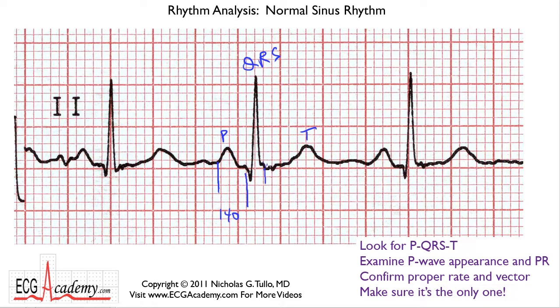But you see this little jiggle here? Is that part of the QRS or isn't it? Well, here's where you need to look at the trees, the individual trees, because if you look at this QRS complex, there's a little jiggle, but it looks kind of different than this. And if you look at the first one, there's a little jiggle, but it looks, again, a little different. So you're better off examining several QRS complexes, maybe use your calipers. But I don't think this is really part of the signal here because it's obviously not there in these other two tracings. So I'd say the QRS complex probably ends here, and that would give it maybe 80 or 90 milliseconds there.